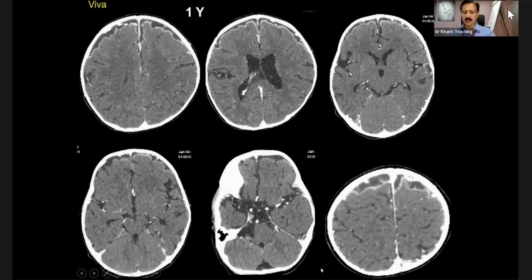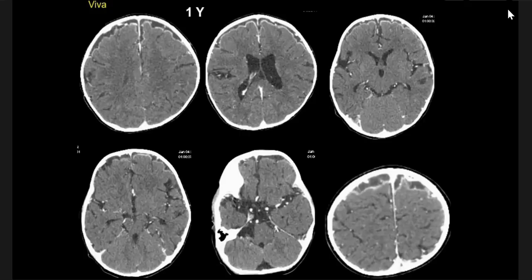This patient, the history is 1 year old and not well, fever and things like that. So I've got axial slices through a 1-year-old's brain who's generally unwell with fever. They are contrast enhanced. There is generalized contrast enhancement, most notable in the frontal lobes bilaterally.